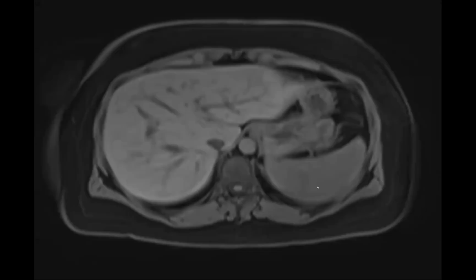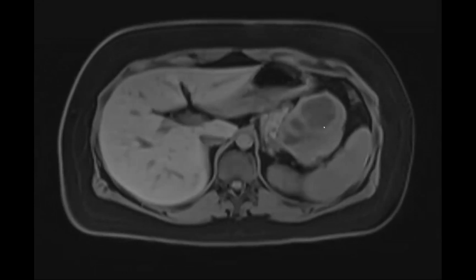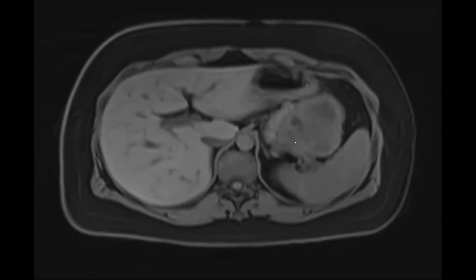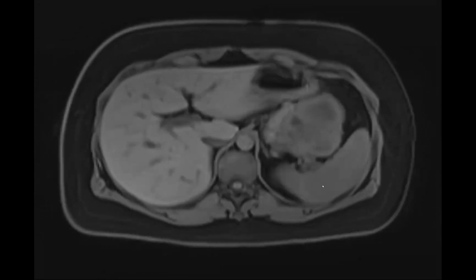But one clue here, and it kind of doesn't matter. This is a surgical lesion. It's a cystic and solid mass. It's arising from the pancreas with this claw. It has to come out, especially in a younger patient.